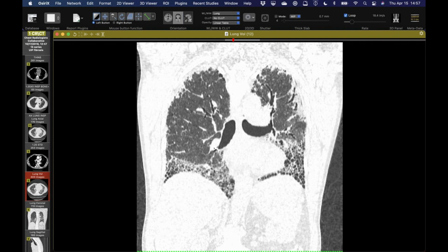And what's kind of neat is that horizontal or straight line sort of is preserved even after a couple of years. It's about 2 years later. He's doing worse. He's more short of breath.